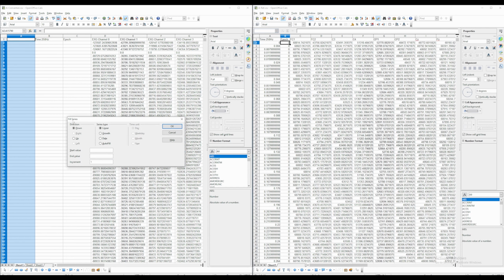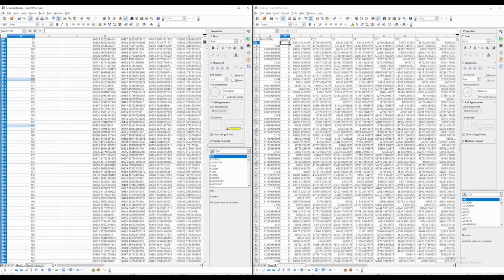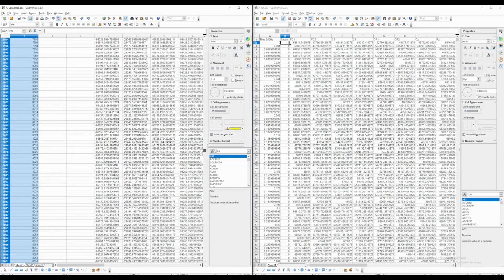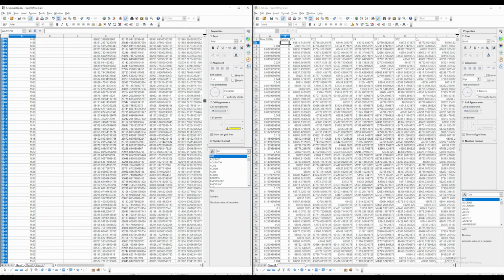And this does the same thing. So direction is down, start value is 0. We don't know the end value, and just increment by 1. All right. Now we have a linear series that is incremented by 1, basically a long index for our file.